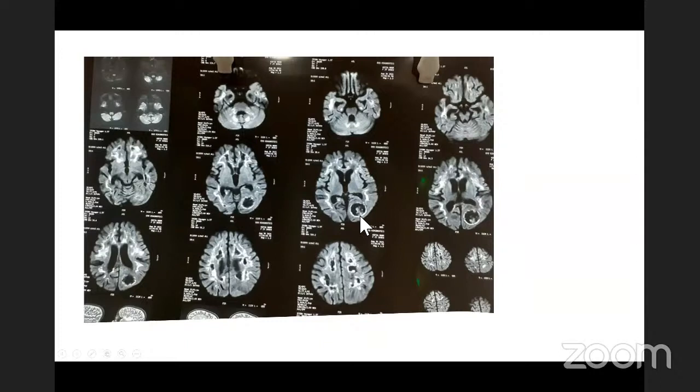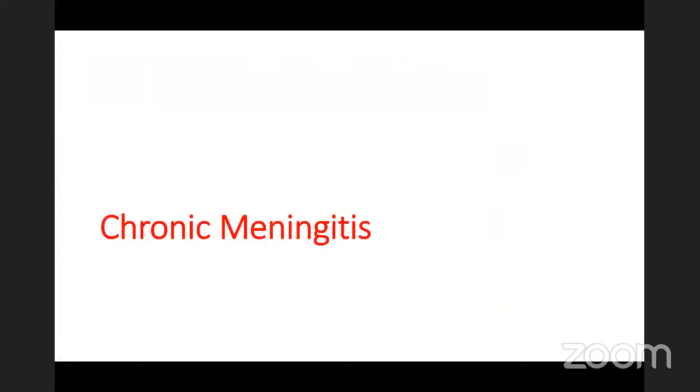So here, this child we diagnosed by fungal culture and also by the MRS that this turned out to be a fungal abscess, and the child was treated with antifungals for appropriate periods with the resolution of this lesion. Next, we come to another entity, which is chronic meningitis.